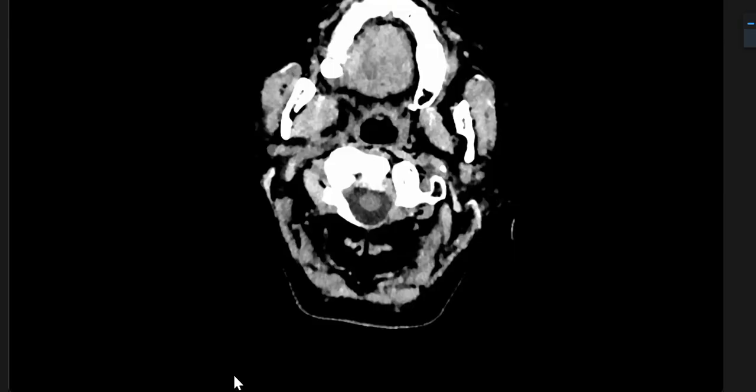This patient needs to be urgently referred under the two-week pathway to the lung MDT, and the whole stack of the images needs to be checked for staging, to assess also the pelvis and the abdomen.